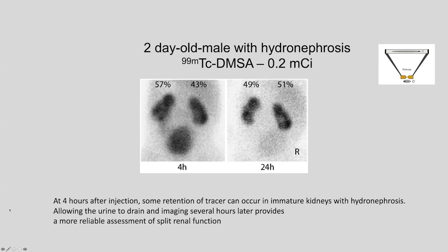But this is misleading because this split function is calculated including tracer in the urine. So one can wait several hours to let all of this urinary activity drain.